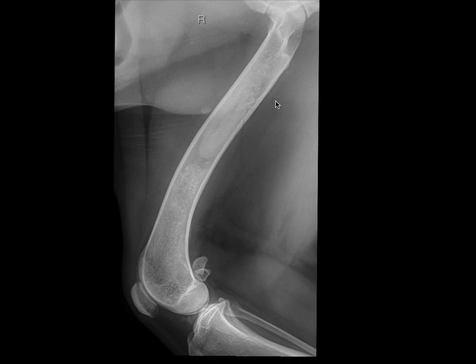To look at the findings, I will bring your attention to the medullary cavity of the femur. Especially in the proximal diaphysis, you'll note that there's increased opacity and there's soft tissue opacity where normally we would experience more of a fat opacity. There's also loss of the normal trabecular markings.